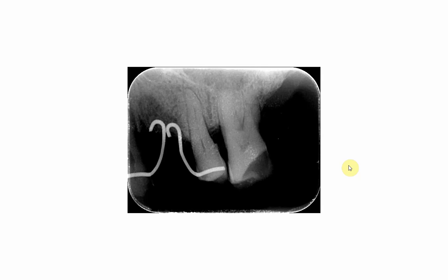Anything that can be removed from inside the oral cavity should be removed, except things that cannot be removed, like bridges, for instance, crowns, retainers, the orthodontic bands and retainers, and so on. Otherwise, the image will show it. Suppose you want to see a pathology over here. The stainless steel clasp will mask the area.